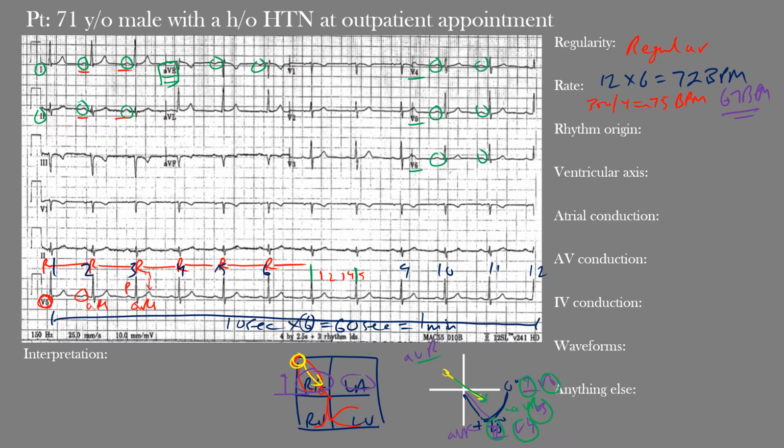This one here is our T wave. If you went through this whole thing, you would see there's always a P wave with a similar morphology preceding a QRS complex, and there's always that 1-to-1 ratio, 1 P wave for 1 QRS complex. And because this EKG meets all of that, we are in fact dealing with sinus rhythm. So our origin is from the sinus node.